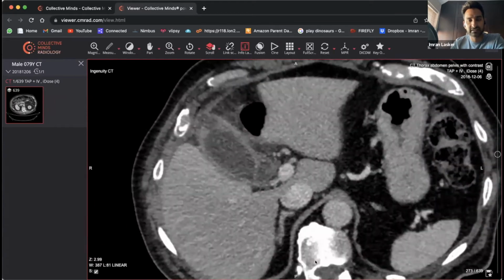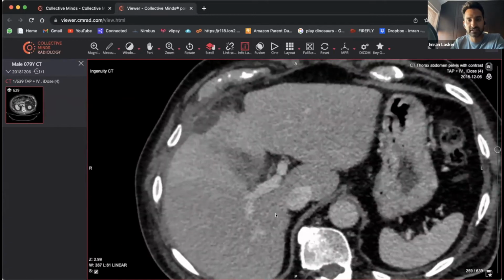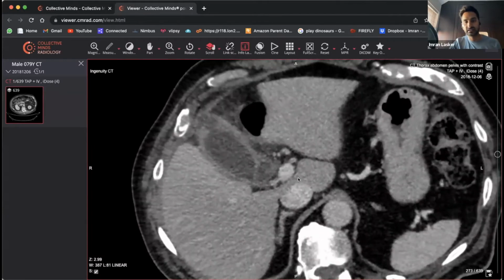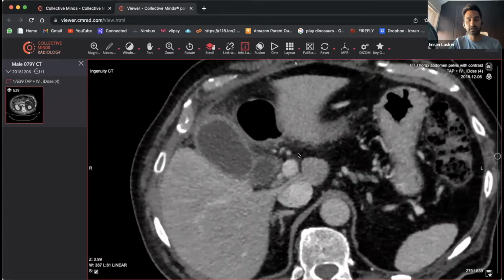But you've got the gallbladder sitting there, and then you've got to look at the intrahepatic duct. So you've got the portal veins and all these hepatic veins sitting here. And next to those, what you'll have are the intrahepatic ducts, and they'll be sitting in this region here and this region here. But on this image, we don't really see much in the way of any low density adjacent to it, which must mean that there's no intrahepatic duct dilatation. If you had low density on one side of that vessel, then you're looking at intrahepatic duct dilatation. If you've got low density on both sides of the vessel, then you have to be looking at something like periportal vein edema, periportal edema.